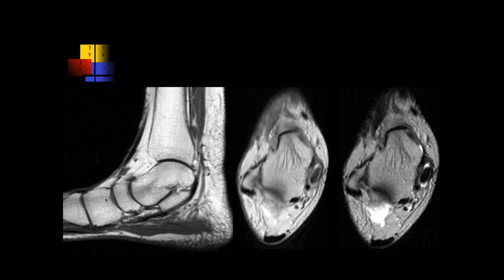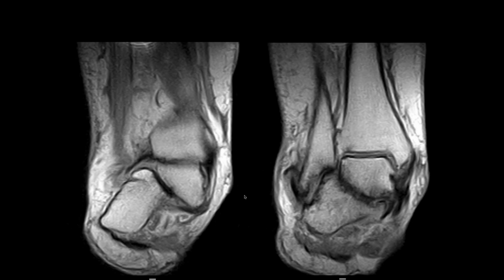Good. And then here's another one, another pes planus, abnormal posterior tibialis tendon. It's markedly enlarged. You got fluid around it, and this is chronic posterior tibialis tendinopathy with another acquired flat foot deformity patient. And then if it continues, what you can then get is, since you no longer have proper medial tug on the bones, the navicular, and remember a big component of the PTT goes to the calcaneus as well, if you remember that anatomic structure that we had. When it fails, the calcaneus then is unstable and it goes into valgus.